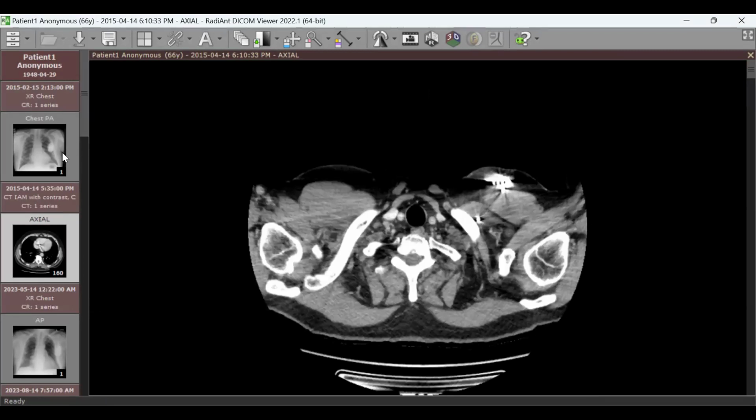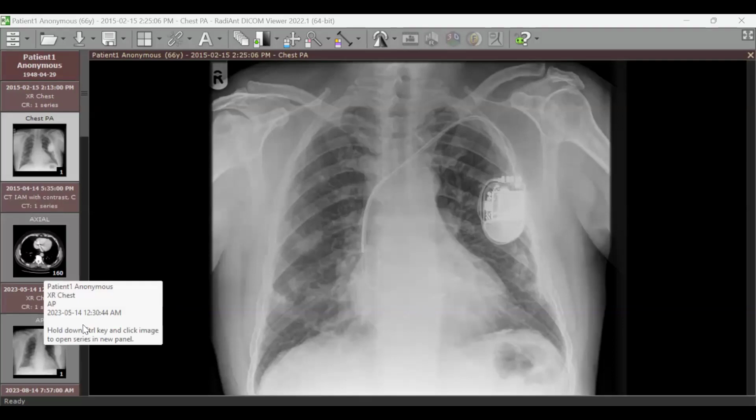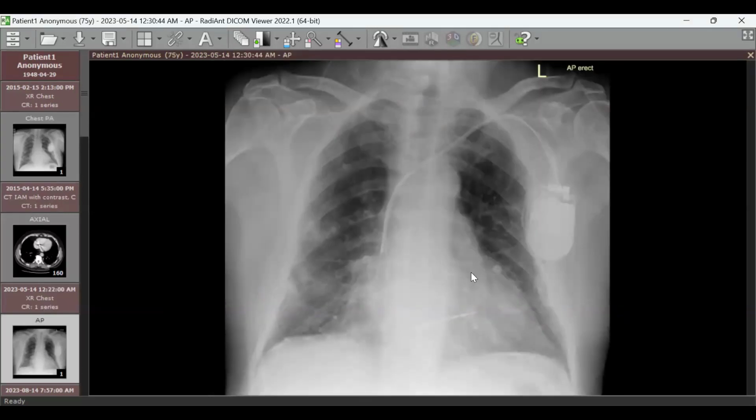I'll show you first the chest X-ray of this patient. Make sure I have the dates. This patient presented with long-term shortness of breath. I think the older one. Yes, this is the one that's present now. So start your description, please.